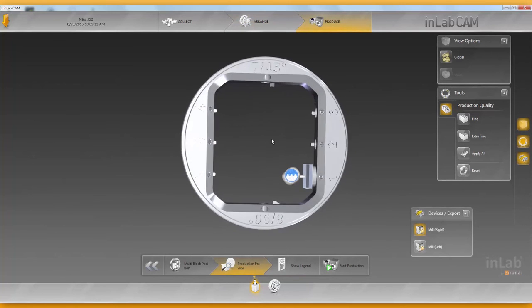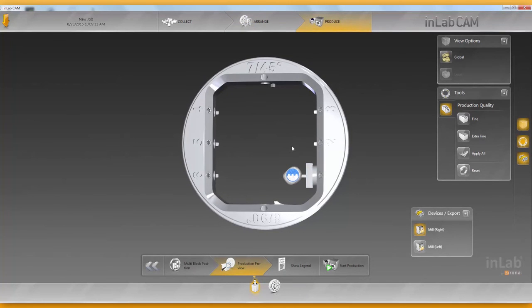All right, so now it's in spot number 1. Let's say we want to go ahead and, oh, first of all, we have fine or extra fine, however we want to mill it. Fine, click on it. If you want to change it to extra fine, click on it there as well. With extra fine, you will need to have all 4 burrs in your magazine.